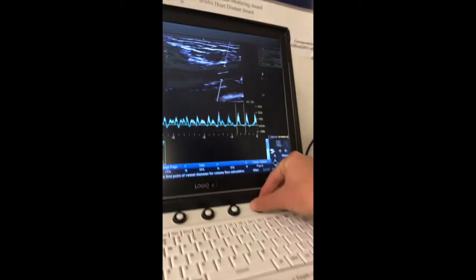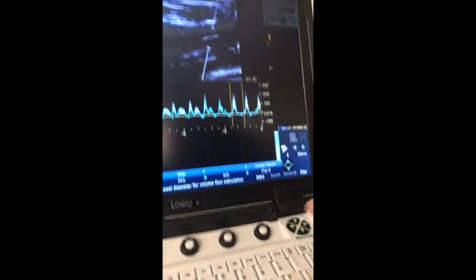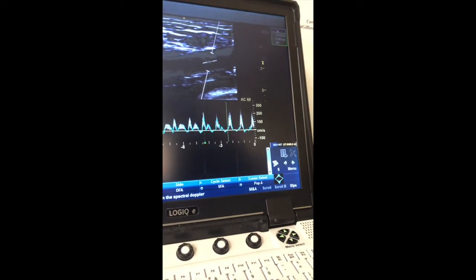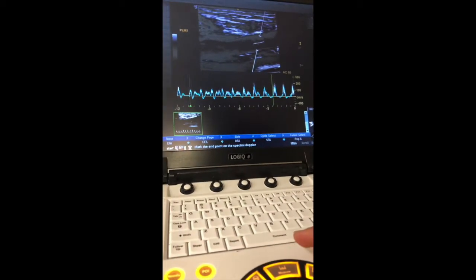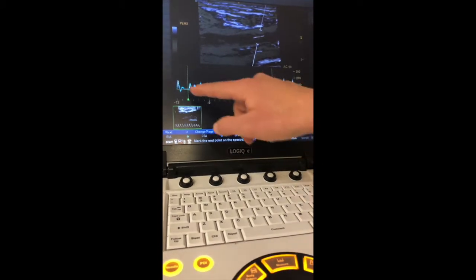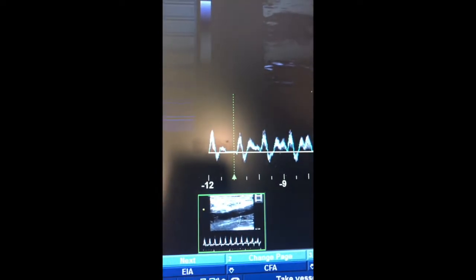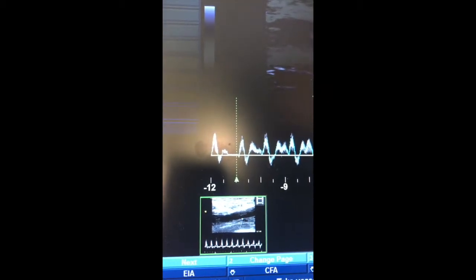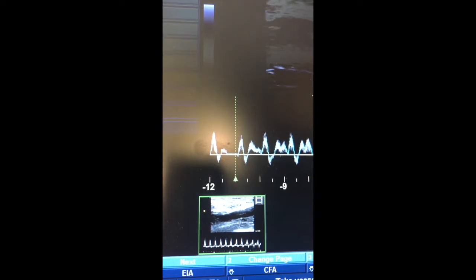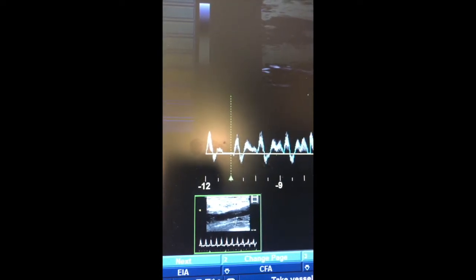and we're going to scroll this top right one. We're scrolling, and we're going to move this cursor over. It's a little difficult to see. We're going to move it until it lines up. This one you'll have to be a little bit more precise on than for the baseline, because the baseline automatically stops. But it should be right over that dash.